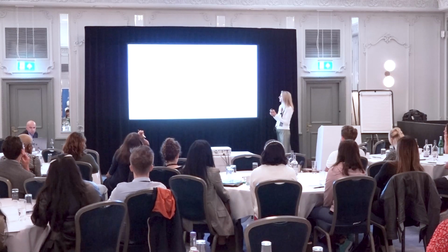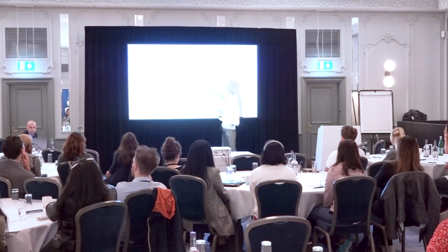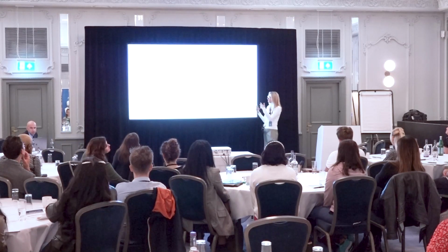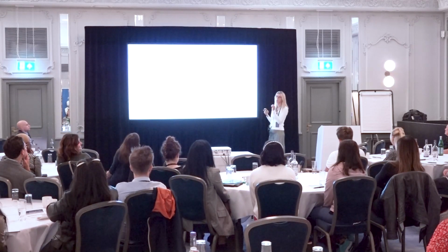root is coming out. So when we talk about, say, the L4-5 level, you'll find neuroradiologists will talk about the foramen because of the nerve that goes through it. So I won't say the L4-5 foramen, I will say the L5 foramen, or I'll say the L4 foramen. I won't just use levels, I'll talk about the specific nerve root.